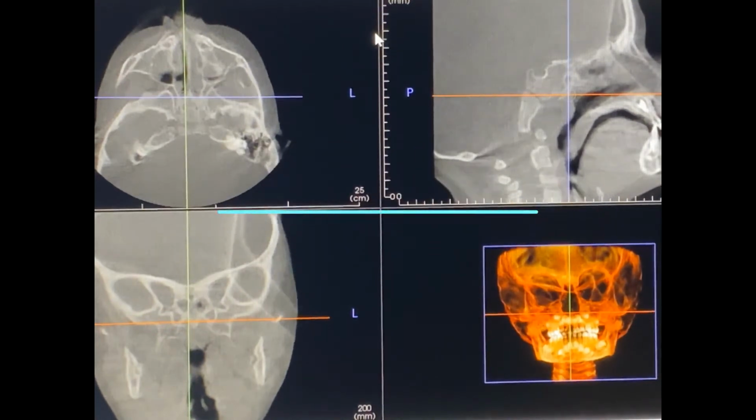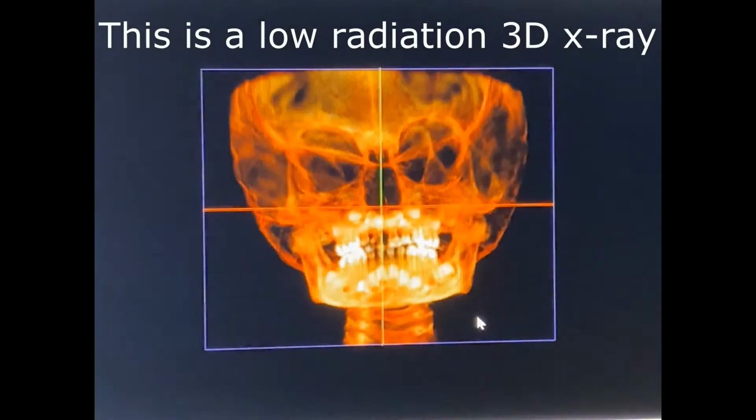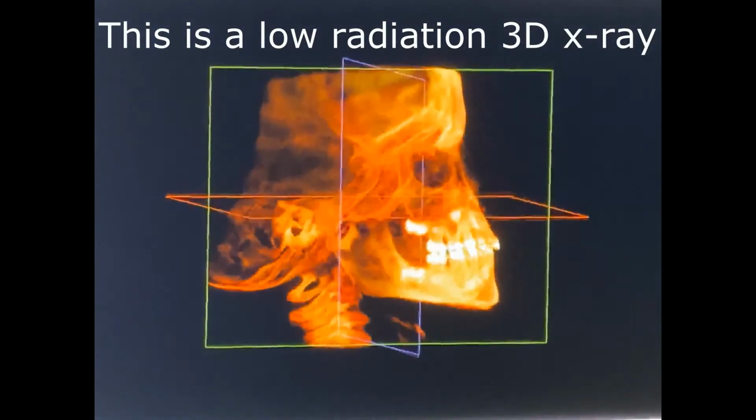Because I always talk about airway-centered diagnostic orthodontics, and I want to show it to you in real life with a patient who showed up today. Now, the mom of this patient said it was okay to show this. I've de-identified it, so you have no idea who it is. And she saw an ENT who said, I know he's snoring, but I can't see anything. I don't know what's going on. Well, if we look at my standard 3D x-ray, it looks pretty cool.